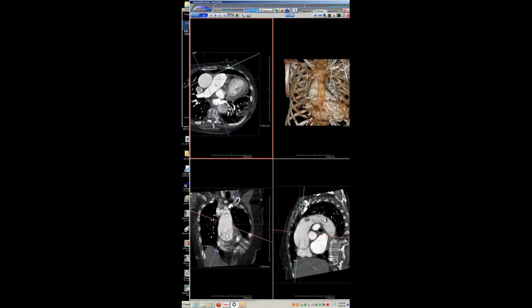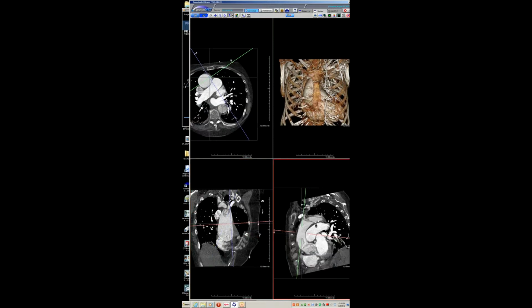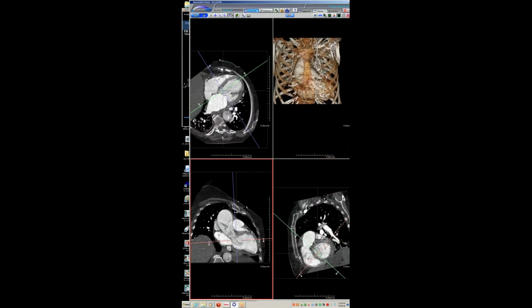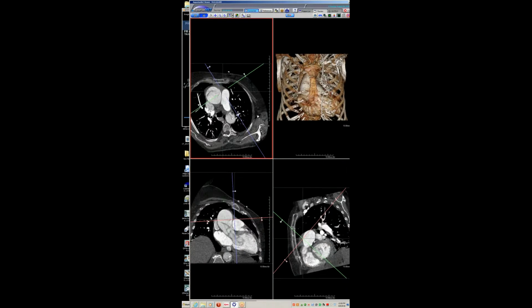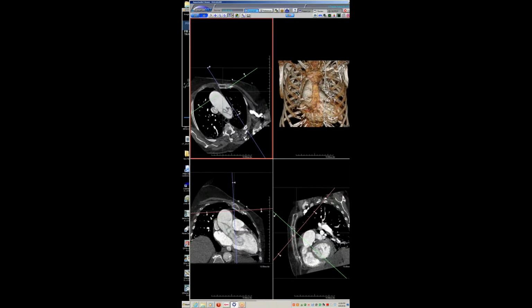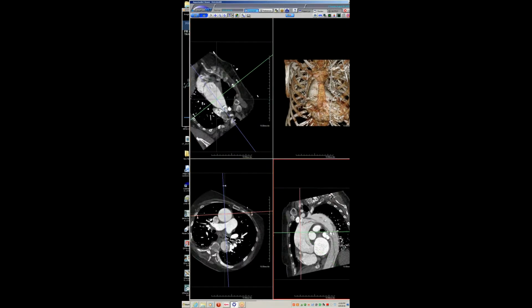Right. So you've got a 360-degree tear. Yeah, exactly. Ascending. And that reminds me of your other case, because I always show your other case with the one that intussuscepted into the subclavian, because it's the same thing. Exactly. And this one went down. I mean, it's just fascinating. Well, you have a circumferential tear at a certain point. Yes. And then it pulls down like a dog. Goes in one direction, antegrade, and the other one goes, in a sense, retrograde. And then the portion between, you end up with the empty aorta sign, in the sense that there's a portion of aorta where you don't see an intimomedial flap.